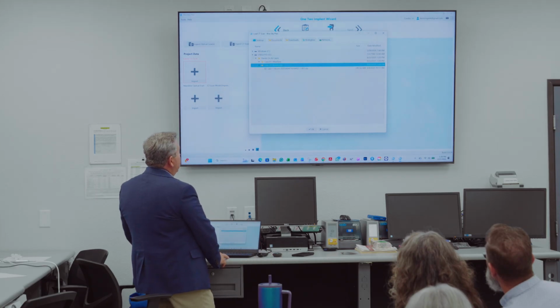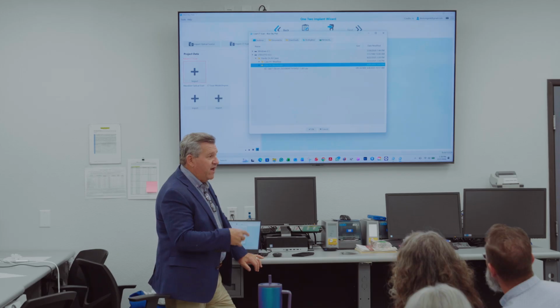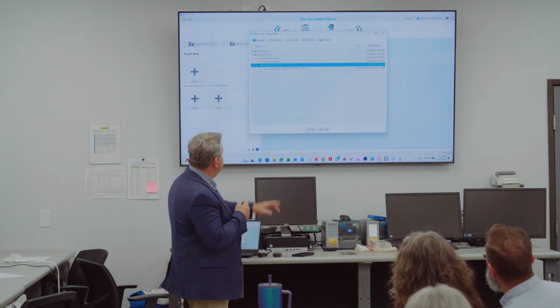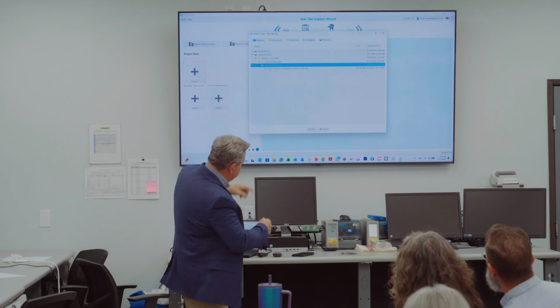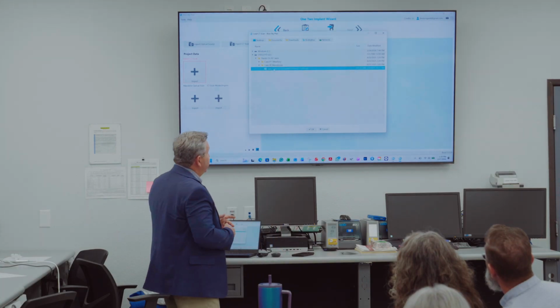Okay? And now the computer looks for zip files for DICOM files. It should go to that file that you just put on your desktop from the thumb drive. It should point to that, and you notice up there where it says we're going to choose mandible, case number 2. And you do have to click on the DICOM folder, the zip file.